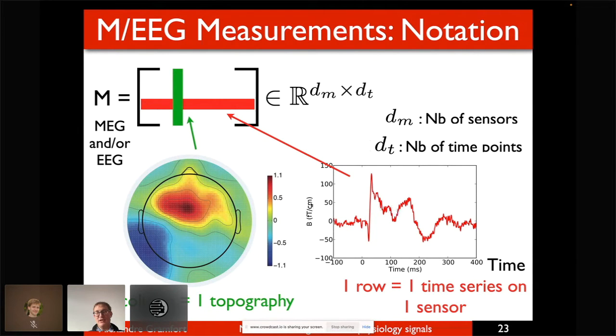Here on the planar gradiometer, you see there's something that is recorded in Tesla divided by distance. So this is femtotesla per centimeter. This is a planar gradiometer. And you see that the SNR is really excellent. So this is obtained by so-called averaging. I will comment on this a bit later. But that gives you an idea of the signal you will obtain. A very sharp transient effect at the beginning, the early evoked component, and then slower waves coming later before having a signal that goes back to baseline, so close to zero, which is where it started from before the onset of the stimulus.